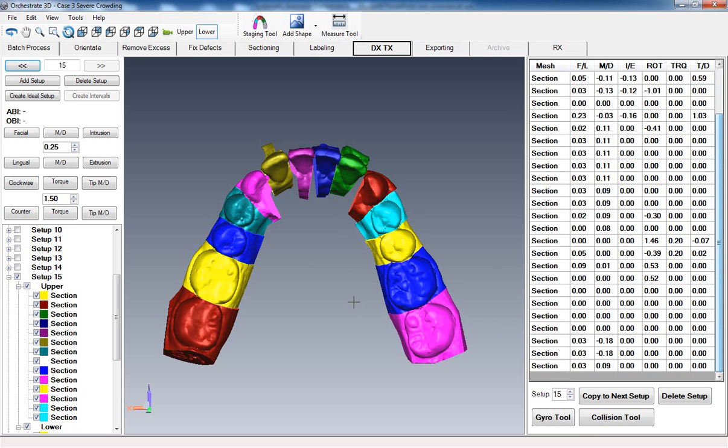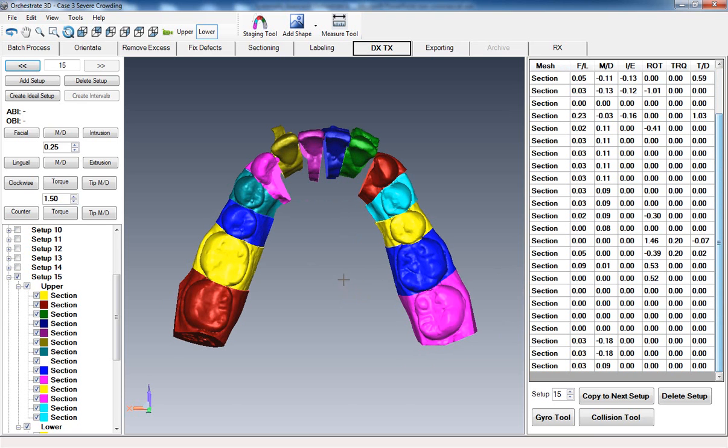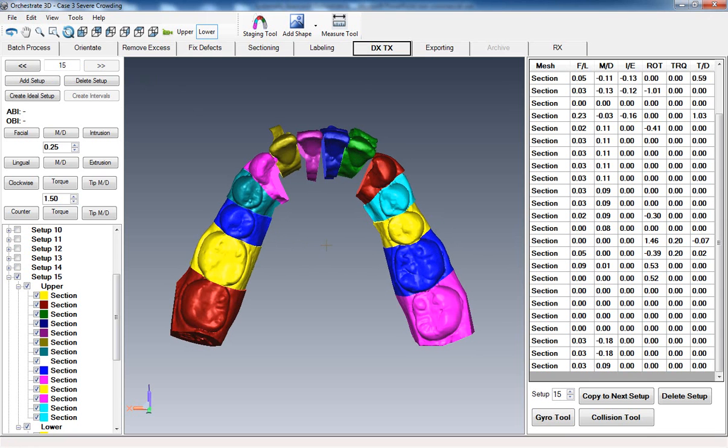And that's it. The next step would simply be to file, save, and wait until this little green bar goes across down here, and then file, exit, and you're done. Okay? Hope that makes sense. I look forward to seeing you in case video number 3.